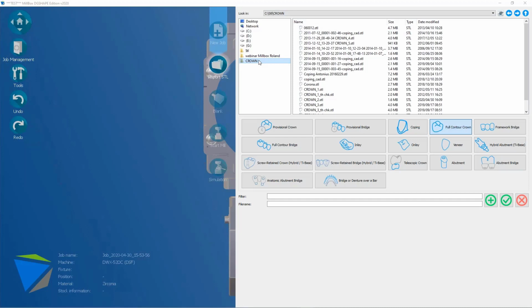Also, you can choose a folder on the network. Consider if you have many computers, many CAM licenses, or different users, colleagues, for example where you have the CAD computer or CAM computer, and you used to share some folder in the network. This could be a good trick to save time, in order to avoid browsing the network looking for the folder.